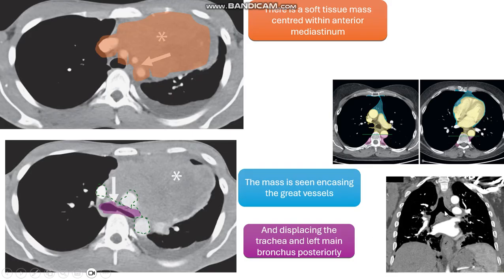Here is the left main bronchus, seen horizontally oriented. It is large, horizontally oriented. It is long, horizontally oriented, and is seen lying inferior to the main pulmonary artery as well as the aortic arch. Okay, so here the left main bronchus is lying inferior to the aortic arch.